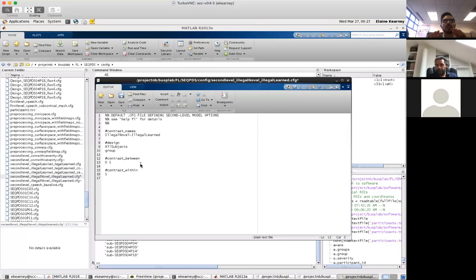So how do I know it's not analyzing each group separately versus comparing the two groups directly? Does that make sense? Because when I looked at this, I thought this would compare the two groups to one another. Right, that's what it does actually. Separately. Is that what it's doing?